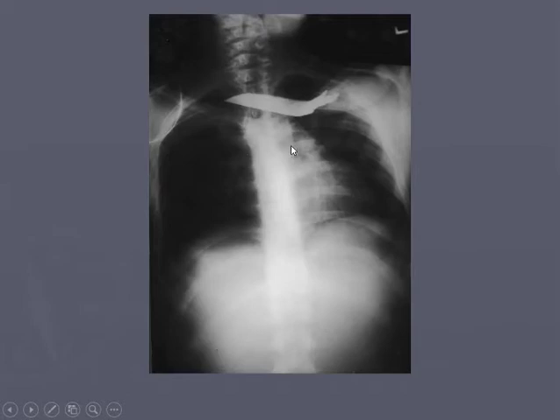So you can identify that. And looking at his x-ray: airway, bone, clavicular head's fine. 1, 2, 3, 4, 5, 6, 7, 8, 9. It's a crappy x-ray, but it's there. Cardiac shadow, diaphragms, can't really see much. It's a poorly exposed x-ray.